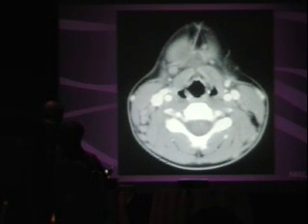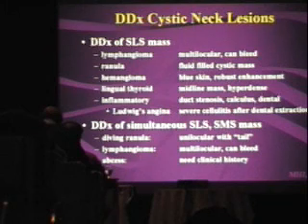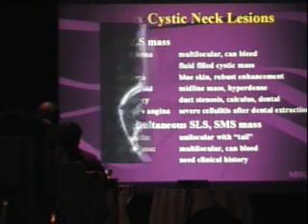What's the point of origin of this? What is this? This is actually a thyroglossal duct cyst that just got so big it kind of dissected up. So again, look at the whole lesion. If things are in multiple different spaces and multicystic, it's easy. Think cystic hygroma. If you think cystic hygroma, give contrast. You can treat to make sure there's not a venous component. And then other things you'd look for are infection, ranula; hemangiomas are fairly common.